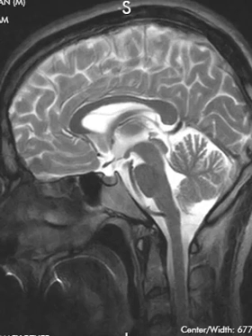Hello, this is Dr. Gay from First Look MRI, and I'd like to show you how to read an MRI of the brain. So this is a patient who has a normal MRI of the brain, and I just wanted to go over some anatomy and show you what we see and what we look for.